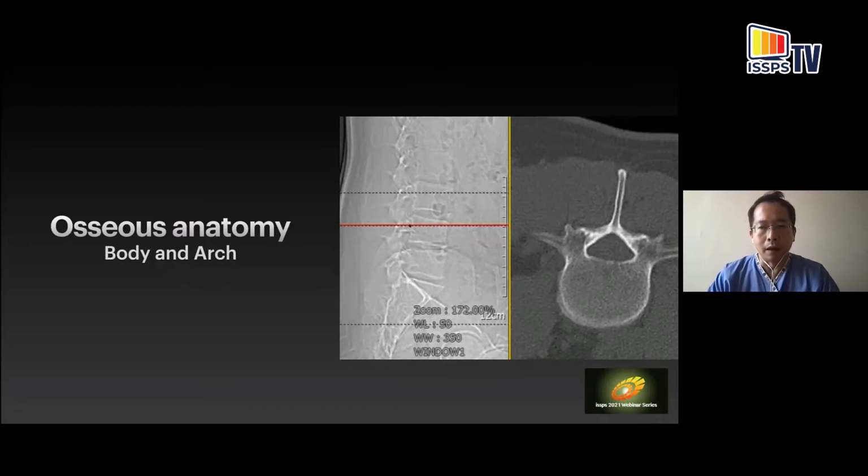body. Now, remember what Dr. Bernard said. The pedicles are attached on the superior aspect of the vertebral body over here. And that's why when you see us doing, say, vertebroplasty or lumbar augmentation procedures, the needles usually take an oblique tract along the transpedicle route from superior to the inferior portion, like that, because of the location of the pedicles.